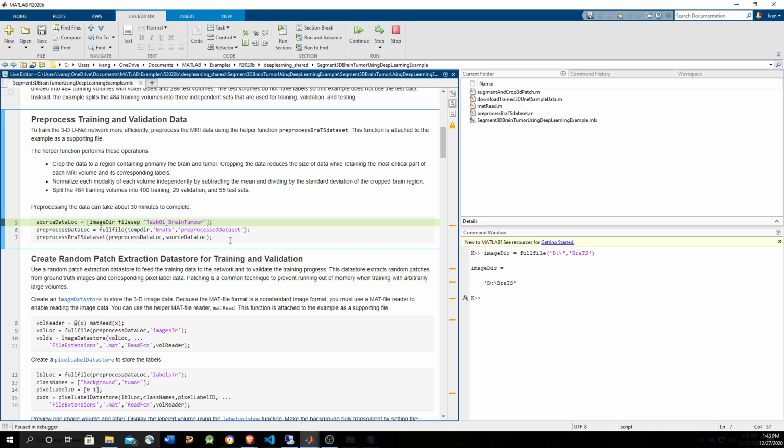We don't have validation data, so we have to split the data into 3 chunks: one for training, another for validation, and another one for testing. We are going to use most of the data for training, 83% of the data. We're going to use 6% for validation, and the rest, 11%, for testing. Okay, so let's do that pre-processing.